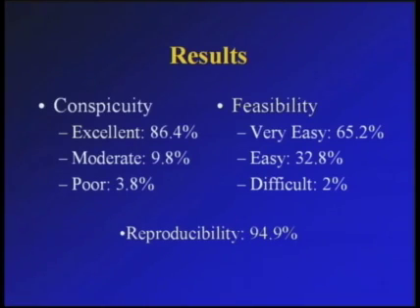In a fetus it's more difficult because the organs are moving with respiration, and the fetus is moving him or herself. So in this case it's quite easy because the organs are static. And the reproducibility of the method was 94.9%.